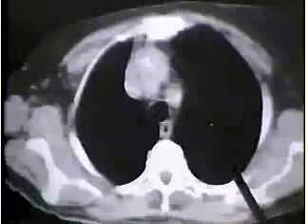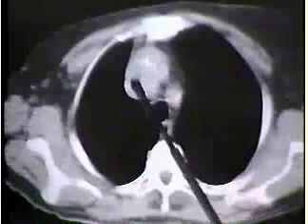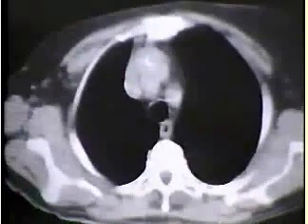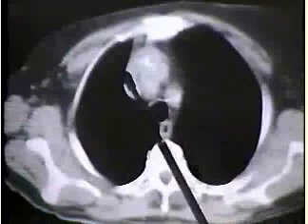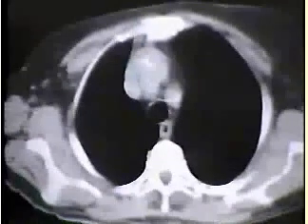Left brachiocephalic vein is coming across here, but we really seem to have an awful lot of vascularity in this region. And I think that you can often be very confused by this, particularly in a non-contrast study, but I assure you that everything you see here represents distended blood vessels in a patient with heart failure.